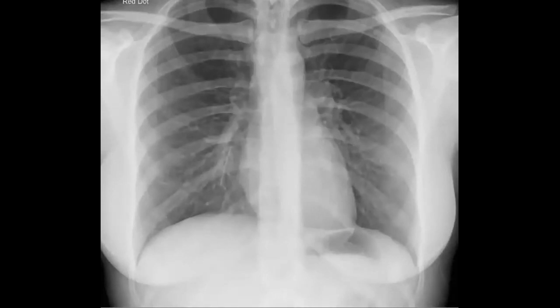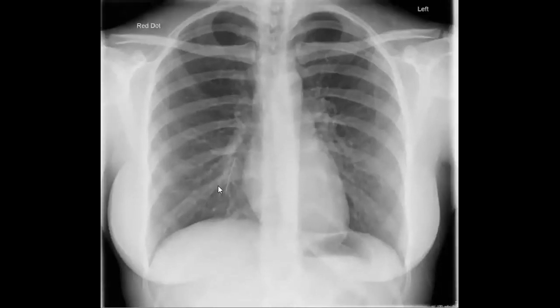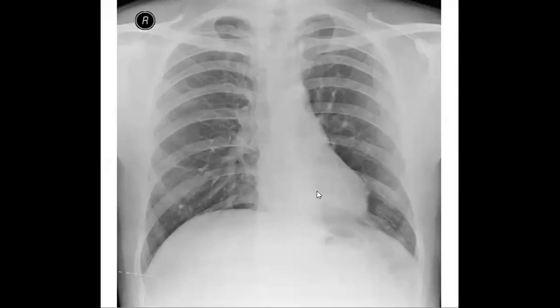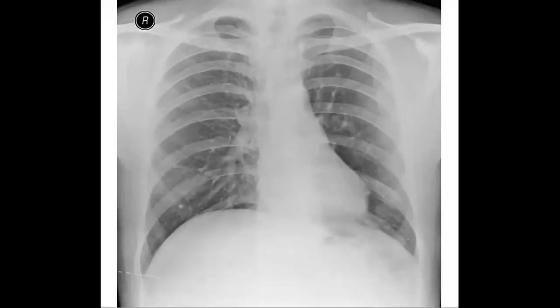So what do you think? This one, I think I showed it before. So, yes, foreign body here. Perfect, Heather. And this one, if you miss it in the exam, it will be a big mistake. So what do you think? Okay, I will just show you here. This is the foreign body. Okay. If you check this one, what do you think?